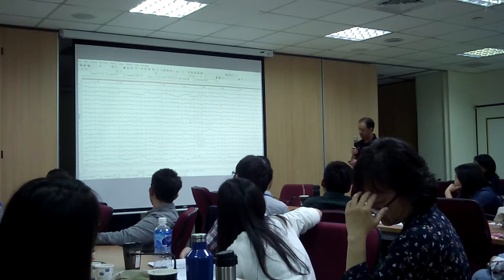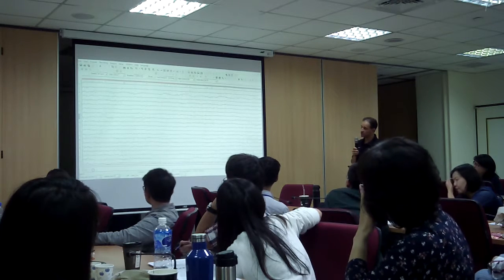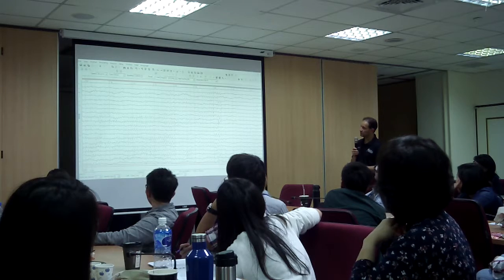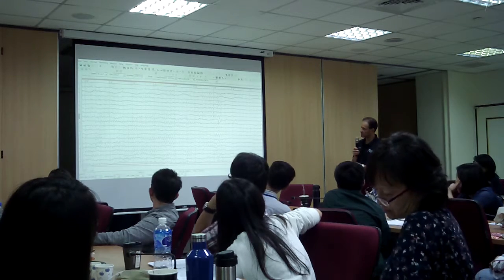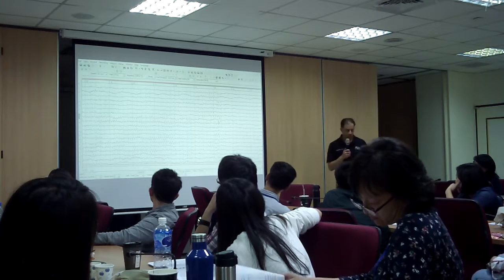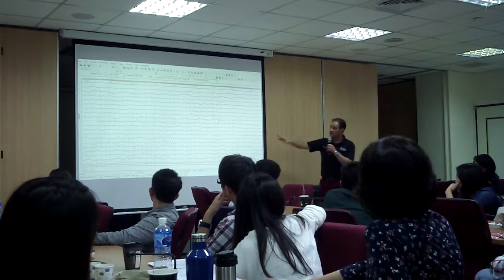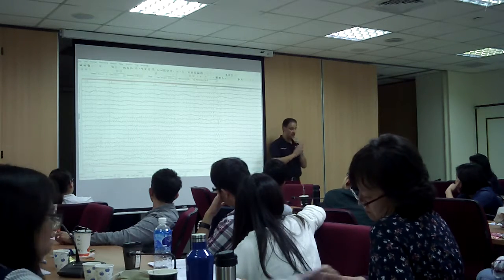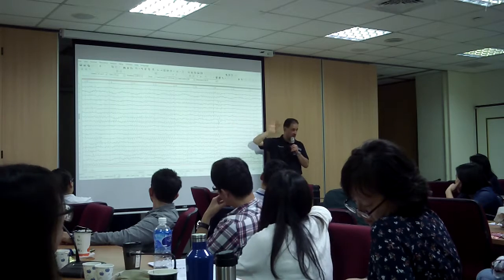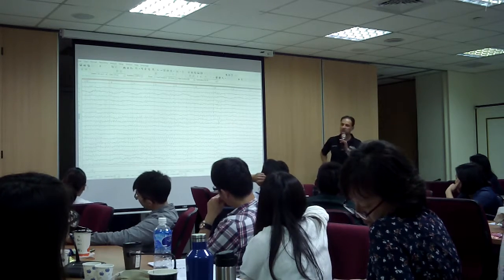So what could that be a sign of? That specifically, that morphology. Let's go back to the morphology, because the shape of the brainwave holds the key, holds the secret. So that morphology right there, what do you think it could mean? Remember, we're looking at this from the functional perspective. So the functional is language: tip of the tongue phenomena, maybe headaches, maybe forgetting the words.